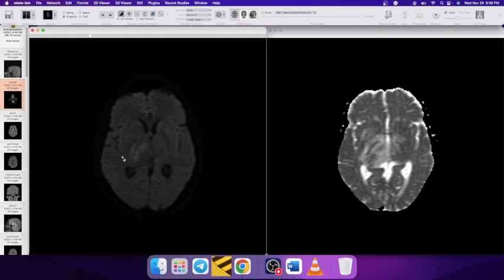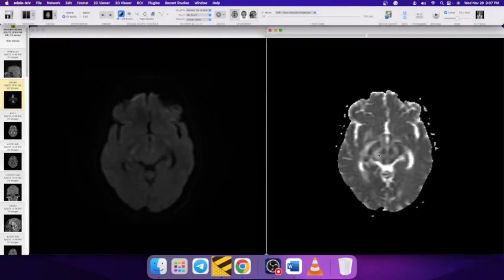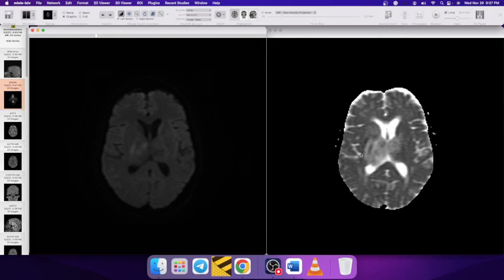Now in this MR brain with spectroscopy, we are going to see a brain mass. We first start with diffusion weighted images, because that's the first thing showing here, and we can see that there are patchy areas of restricted diffusion, which are high signal on diffusion weighted images and low signal on ADC maps. We can also see that most of it, although, is showing facilitated diffusion.